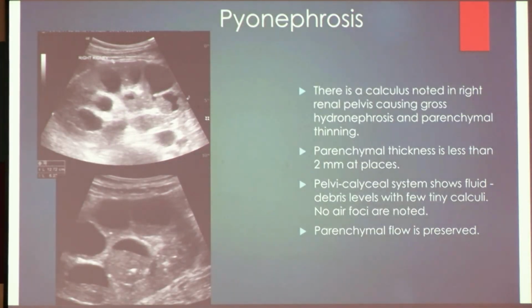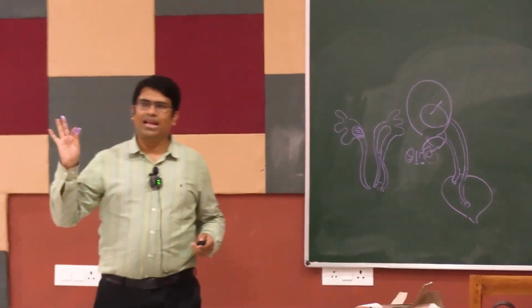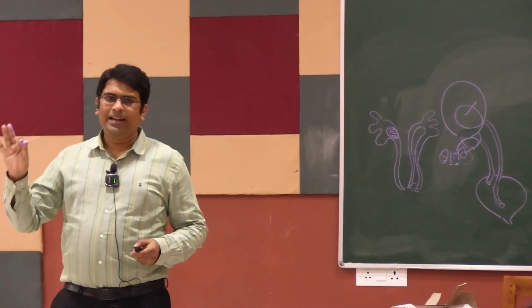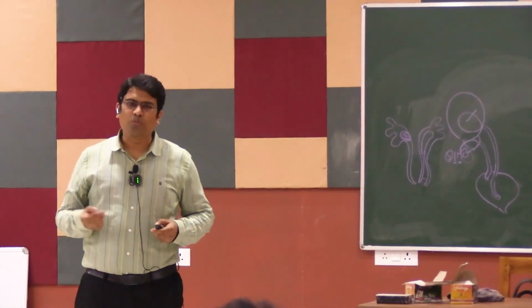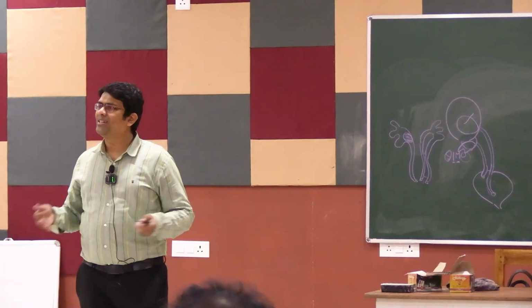What we need to do, see here we can see two things. The stone, actually there was one more better plate, but there is always an underlying cause. As I said, the underlying cause can be a UPJO, but suppose a patient had a pelviureteric system stone. A stone was obstructed here, and he left it as such. He said, okay, it will come out. There are homeopathic options, we'll take that, it will come out. 1 year, 2 year, 3 year.